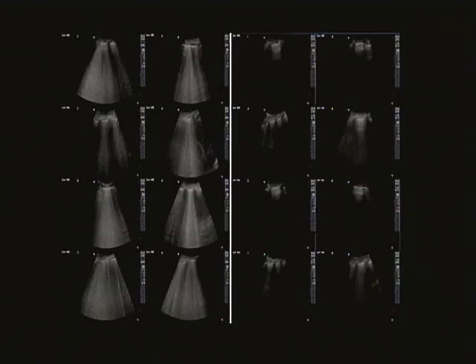Now, from an emergency department perspective, this is exciting, but probably not that exciting, because usually patients are in our departments hopefully for only a few hours, and so I know that's not always true, but you treat patients, you can see they get better. But imagine if you could do this on the floor. Think of all the portable chest X-rays that we get every day in the ICU or on the floor or in our wards on patients that have had treatment 8 or 10 hours ago, and the chest X-ray looks exactly the same. If people could do their own lung ultrasound and look at these changes in real time, you could avoid an enormous number of portable chest X-rays.